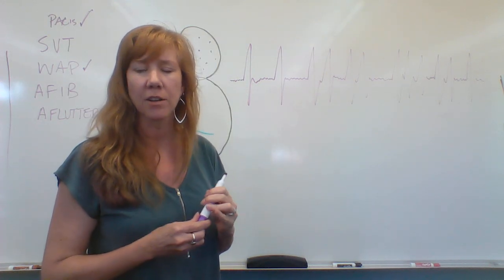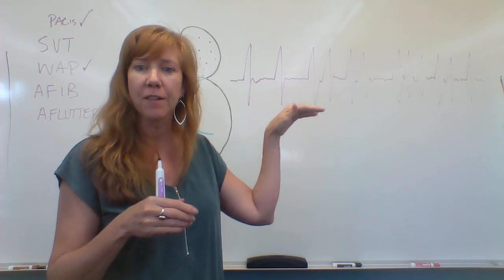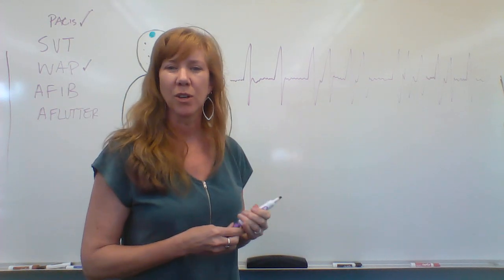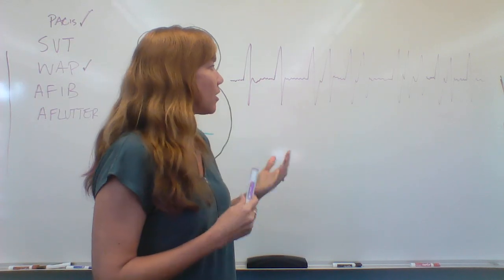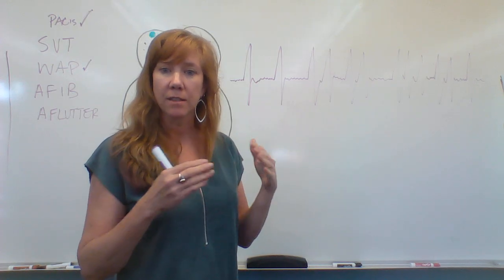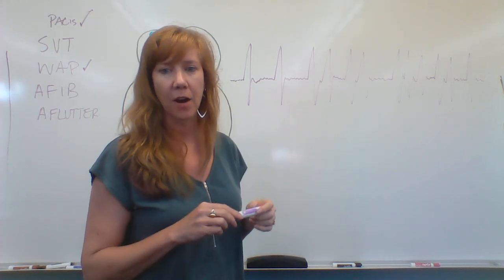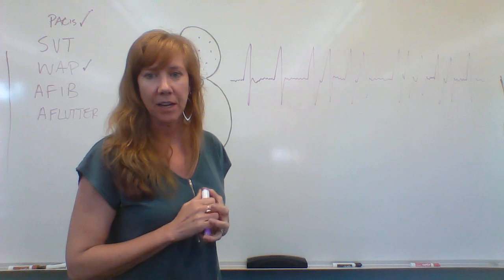It's going to be hard because it's really messed up by the fibrillation waves, is what we call this wavy line. So you can't really get a good QT either. So really all you can do is measure the width of the QRS and get the heart rate, which varies from strip to strip, but you can kind of get a mean of what their average heart rate is. How do they feel when they have atrial fib?